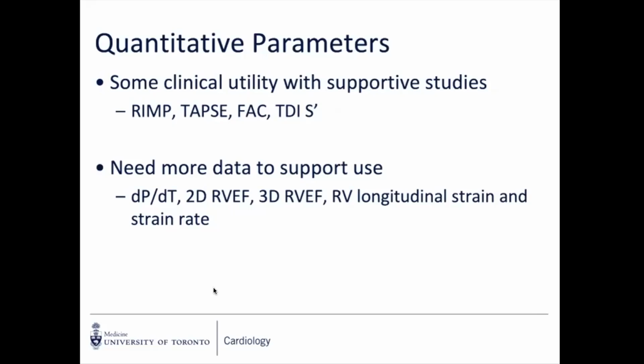I'd probably pay more attention to the four-chamber view, frankly, but you're right, it can be difficult. No, it can be, and that RV focus view is very challenging. Well, we all know RV has two parts, inflow and outflow. We only report the inflow.